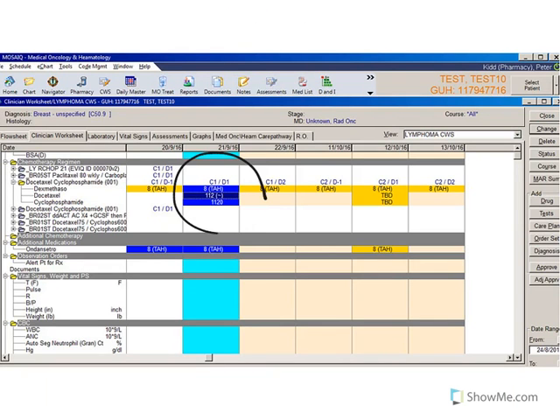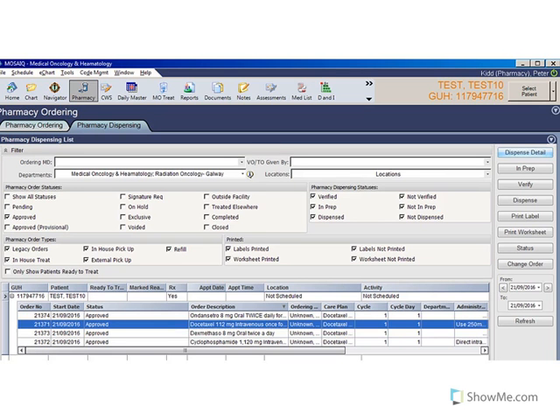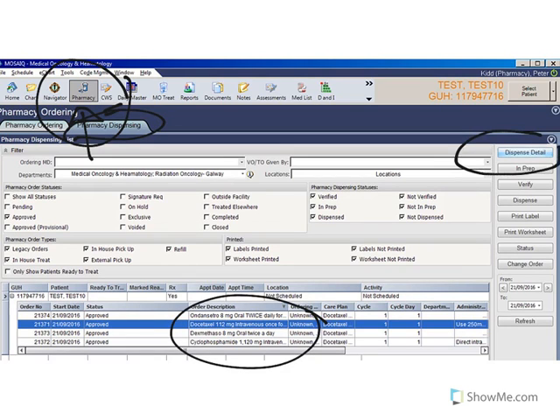Doses have now been approved and populated here in dark blue. Once the clinician has approved them in the CWS, the dose gets passed on to pharmacy and can be seen in the dispensing tab here. This allows the pharmacist to provide details of the volumes and rates and verify the different steps that the product is at, print labels and print worksheets.